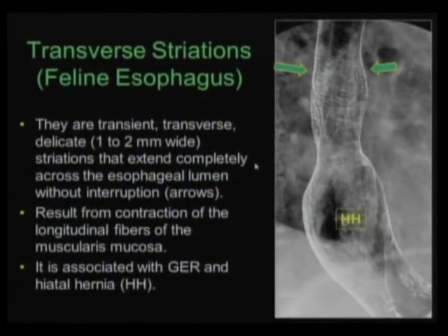They are due to contraction of the longitudinal fibers of the muscularis mucosae, okay, that is irritated by reflux. It's very common. You will see that frequently, okay? And it's associated with gastroesophageal reflux and hiatal hernias.